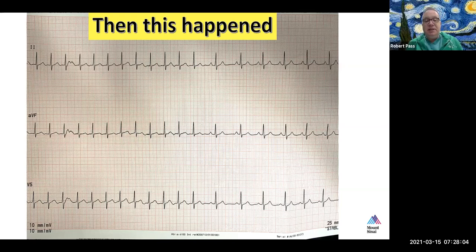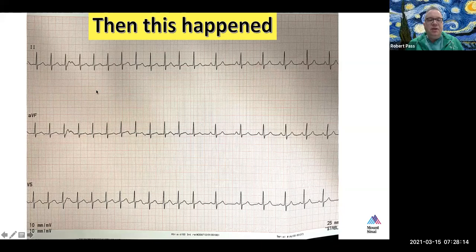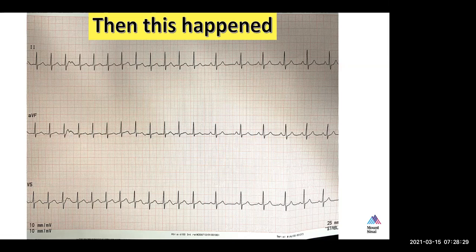But I think the point is that if you look at these QRSs on the right, where we're clearly in sinus rhythm, and on the left, they look very similar. And when we look in the T waves, we don't really see an obvious retrograde P wave. Similarly, the rate is slow. It's a pretty slow tachycardia rate for a child, right? 150 beats per minute.